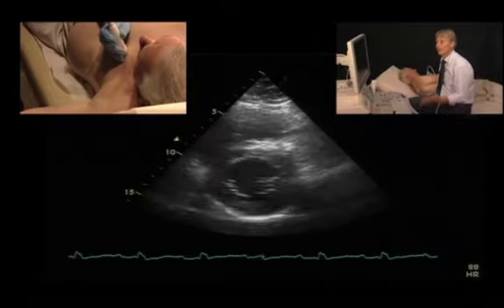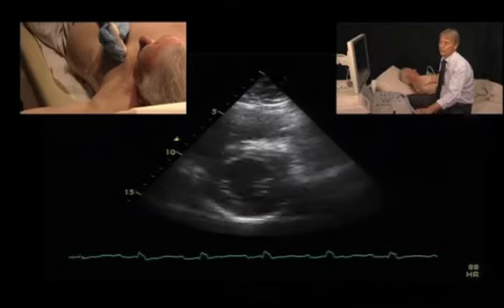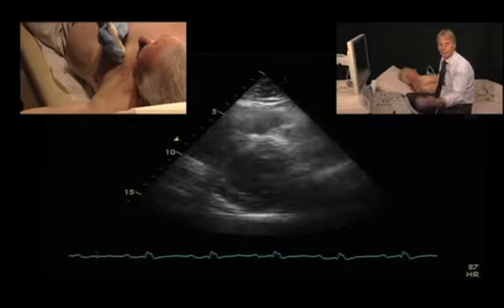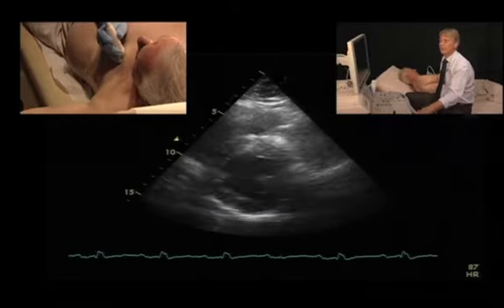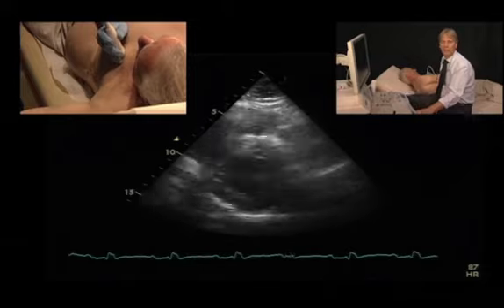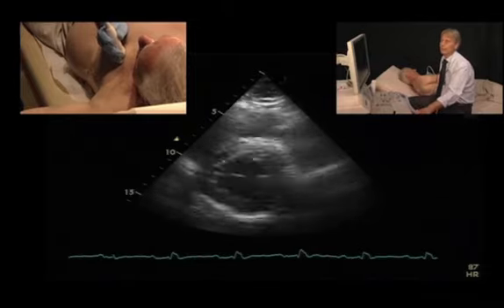Certainly hypertrophy can also be asymmetric in patients with hypertensive heart disease, but this altogether looks very much like hypertensive heart disease. So if you look at the clinic of the patient as well, and you know that the patient had hypertension for many, many years, that diagnosis is quite clear. Okay, so are you ready for the next case?